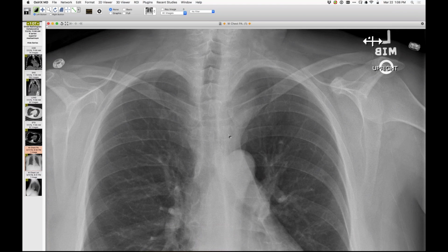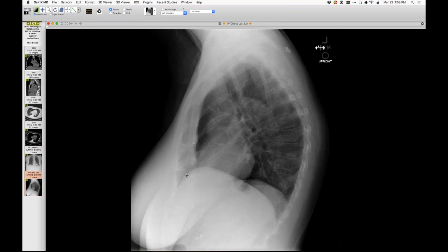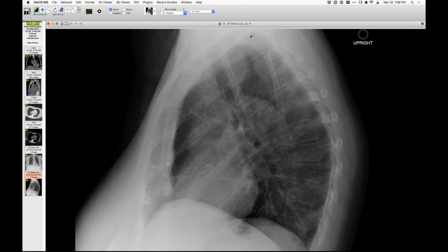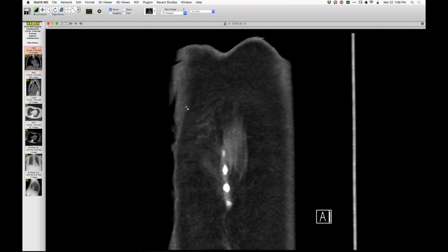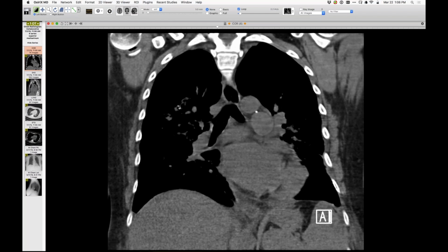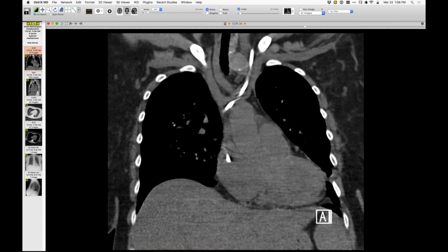The other clue as to what it is, is that there's mild rightward displacement of the trachea. And then when we go to the lateral projection, the first place we say it is not is in the posterior chest, which is up here, but rather here, in part. So here it is, right here, but again, it's traversing the thoracic inlet. This case goes back a couple of years, but it's a nice explanation for the finding, and the most common cause, all things considered, when we see that is a goiter. And yes, this one is a goiter.